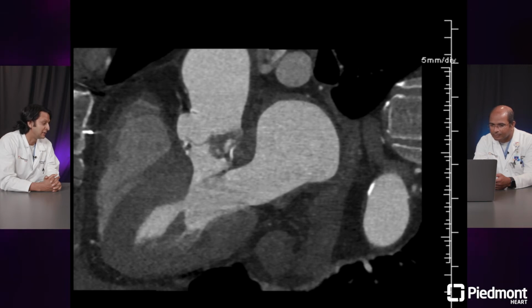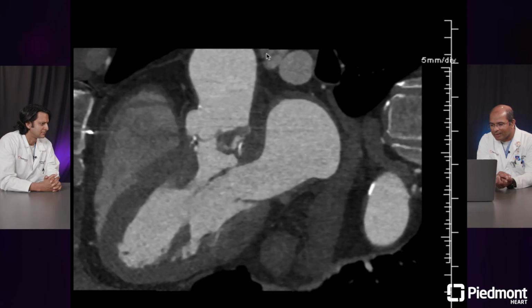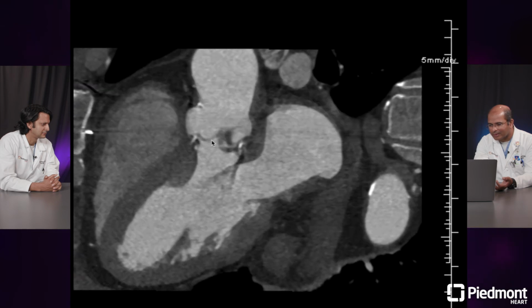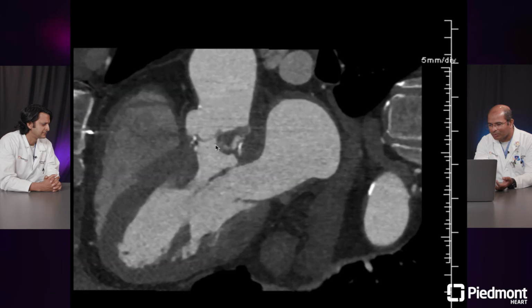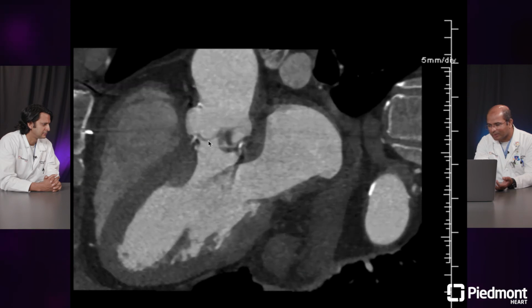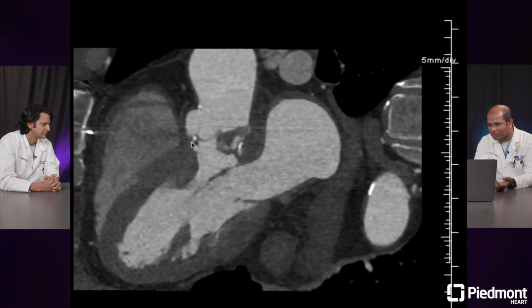So we weren't really expecting to see what we did end up seeing here on the CT. Yeah, on the CT here, you can visualize that there's a bioprosthetic valve, and you can see clearly that on the aortic or sinus aspect of the leaflet here, there's a clearly mobile large lesion that has a stalk attached to the leaflet, and the leaflet itself is thickened compared to the contralateral leaflet here, which is thin and much more mobile.